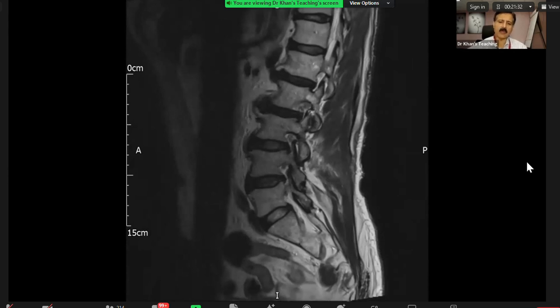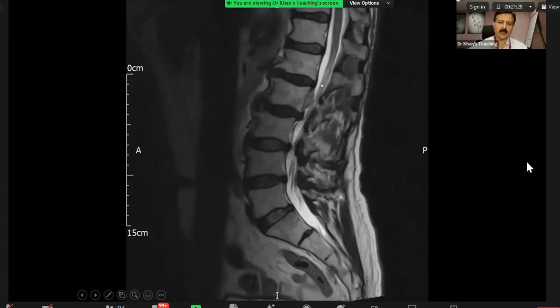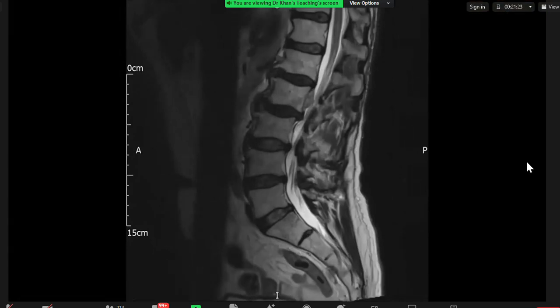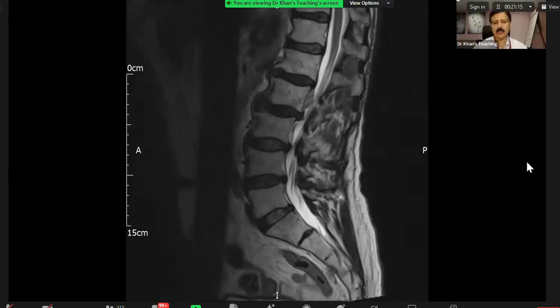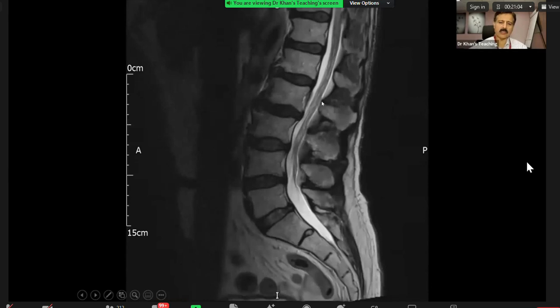Okay, I'm going to show you a sequence of what is happening at this level. There's a protrusion at the disc, bulging of the posterior disc, although it seems separate to the. Where? Point out. No, your mouse is not showing. Yeah, where your mouse is, just near there. Yeah, there. Okay, so let's go to the other sequence quickly to axial.